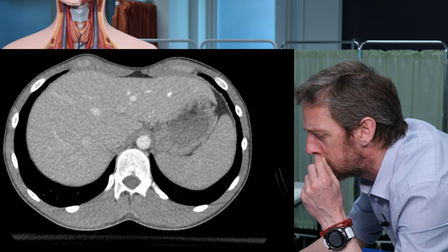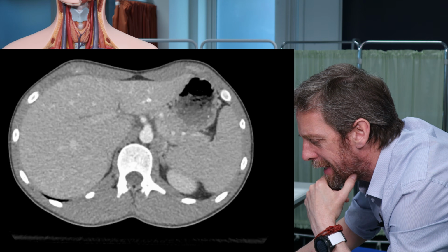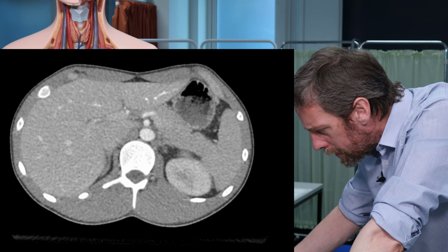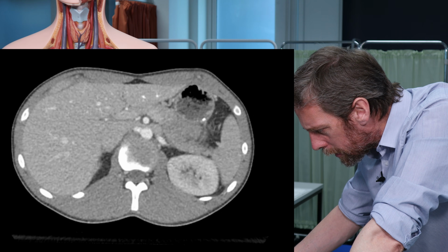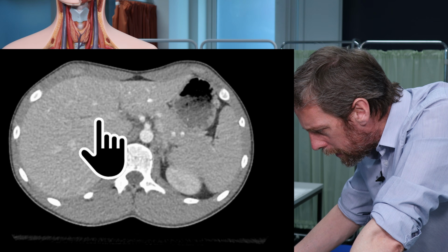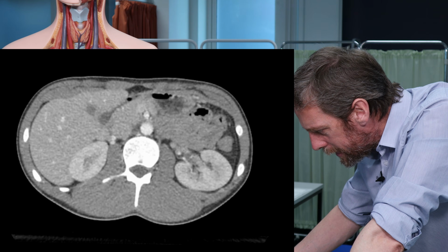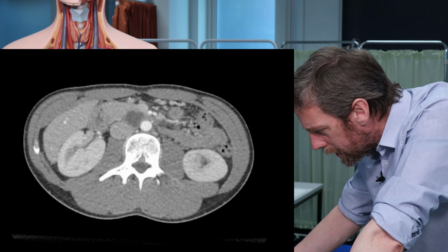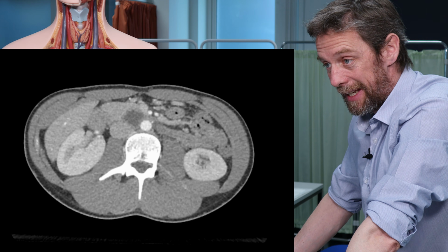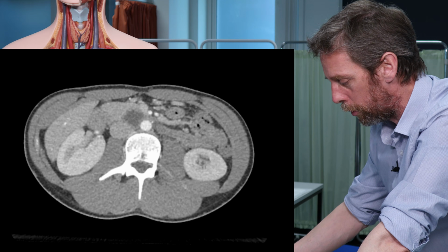All right, what about that mysterious portal vein then? Tricky. Now, the portal vein is going to the liver as well, right? I can see it. Can you see it? This guy here. Really tricky. So as I said, we've got the inferior mesenteric vein, superior mesenteric vein and splenic vein coming together in some configuration to form the portal vein.